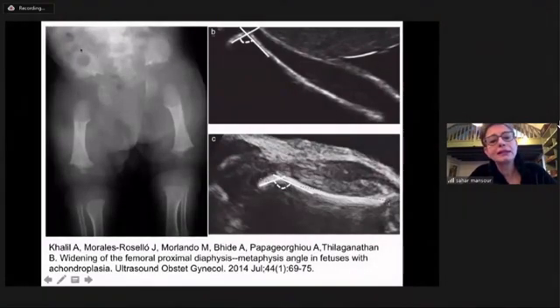And I thought you'd be interested to see this X-ray of a newborn baby with achondroplasia, showing what the radiologists describe as ice cream cone proximal femora. And you can see the lucency in the proximal femora because of the sloping metaphysis, which you can see antenatally with this increased angle. So it represents exactly what you're seeing here on the neonatal X-rays. The other clue here is the trident acetabulum and other features that will give us the clue. So I just thought you'd be interested to see why you're seeing this increased angle.